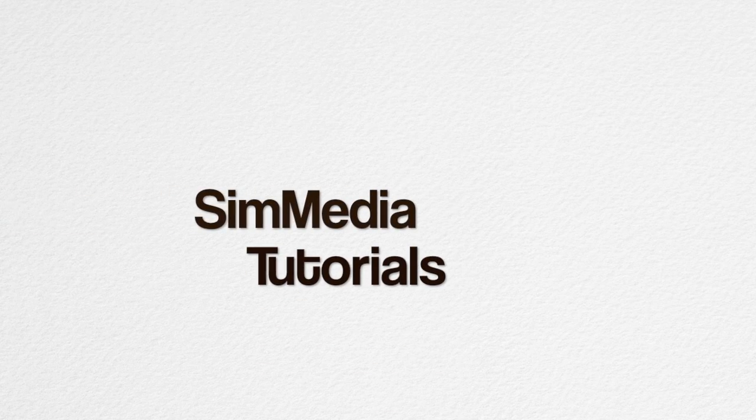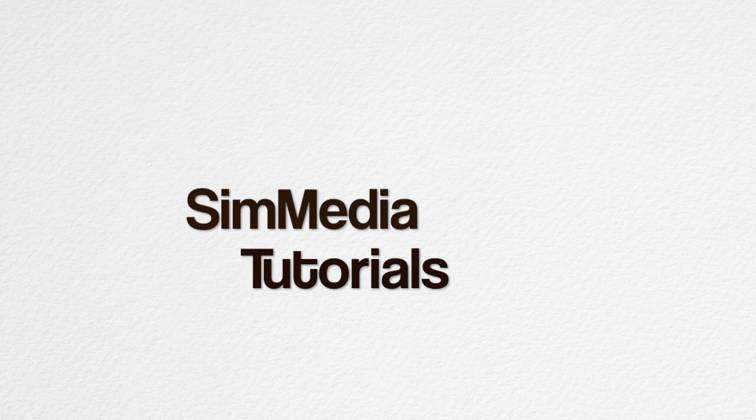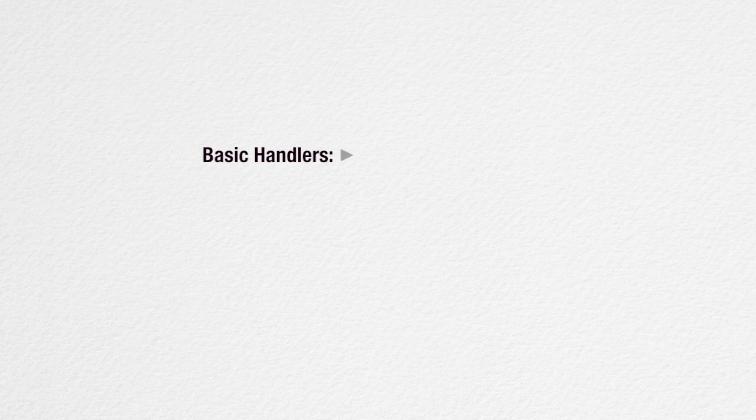Hello, in this tutorial I'm going to show you how to program a handler and how it can save you time during a scenario, leaving you free to focus on the learner instead of the computer. A handler allows an event to trigger a patient response or action no matter where you are in the scenario.